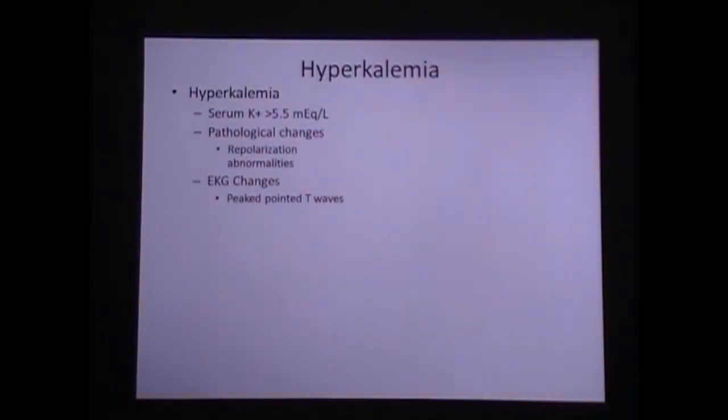Hyperkalemia is defined initially as greater than 5.5 milliequivalents per liter. Pathological changes, you have repolarization abnormalities. You can get the peaked pointed T waves.